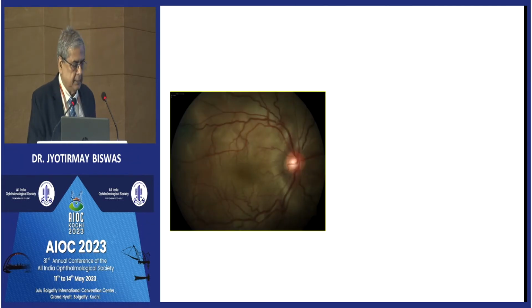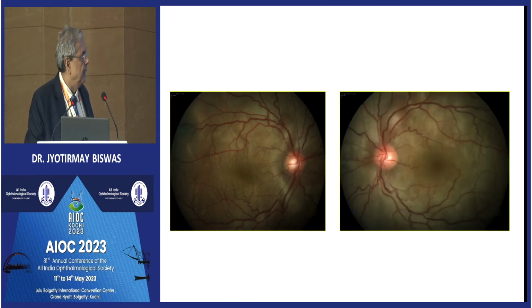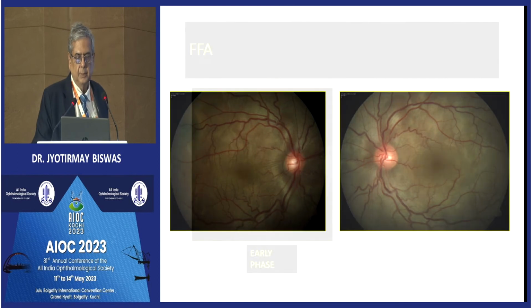This is the fundus fluorescein angiogram. I will be showing a case of VKH, with sensory retinal detachment in both the eyes.